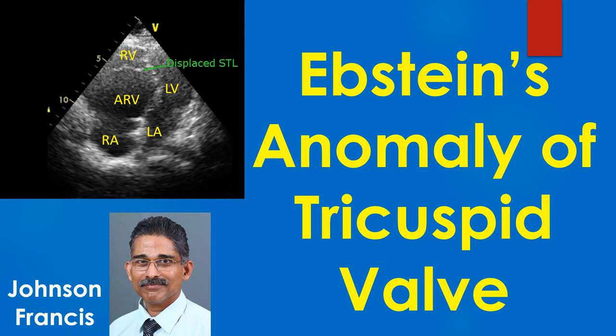Ebstein's anomaly is one of the cyanotic congenital heart diseases in which natural survival to adulthood is not uncommon. Echo picture demonstrates the gross distal displacement of the septal tricuspid leaflet and the atrialized portion of right ventricle marked as ARV.